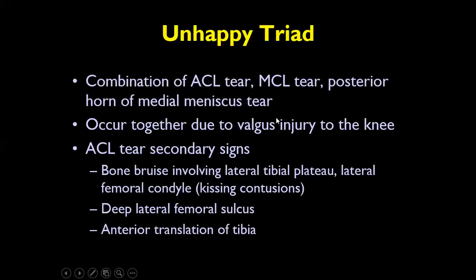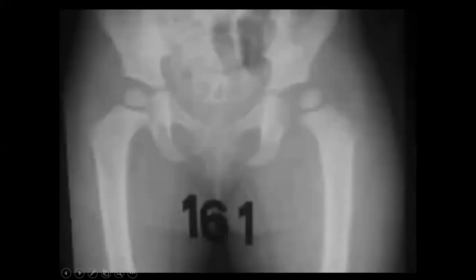So let's go further and see this patient. I think maybe I got to the answer, but okay. Let's try to think what could be the differential and where is the pathology. So when you see the pelvis of a young or child patient, you are thinking about either slipped capital femoral epiphysis, like the previous session, or maybe DDH, one of the differentials.